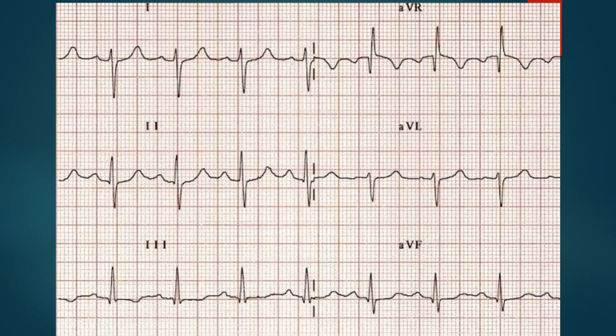In this example, the equiphasic lead looks to be lead 2, and the perpendicular lead to lead 2 is aVL. aVL has negative deflection, which indicates the axis is around the negative pole of aVL. The positive pole of aVL is minus 30. The negative pole of aVL is plus 150. The axis is plus 150 or around that. It indicates it is right axis deviation. That's why lead 3 is positive and lead 1 is more negative.